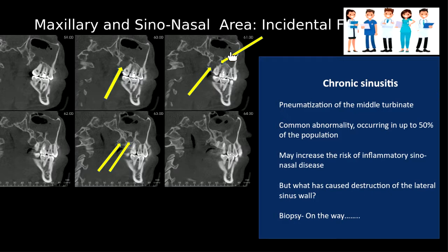That means the cyst got infected and went through the sinus floor, giving inflammation and causing sinusitis in that area. The bone around that is pretty sclerotic in the other views. And here also you can see there's a bubble there, and the bone is thick. And these are multiple OKC in this area.